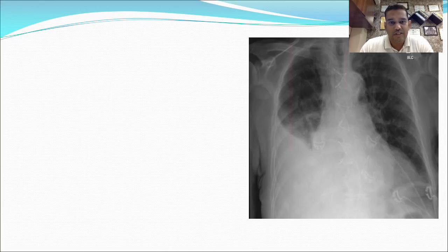Next X-ray is this. So which X-ray is this? You could say this is a plain X-ray or a contrast X-ray. It is a plain X-ray, but there is something that is radio dense. You could appreciate a figure of 8 type of material over the anterior part of the chest. The patient might have had an open heart surgery. These are the steel wires that have been used to close the sternum, the bone. This is an ECG lead you could appreciate. So keep that aside.